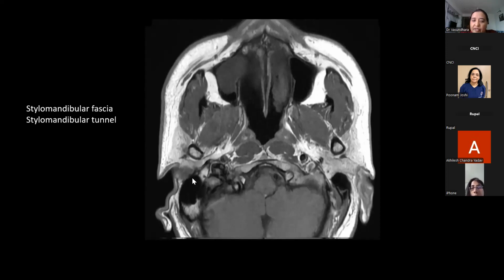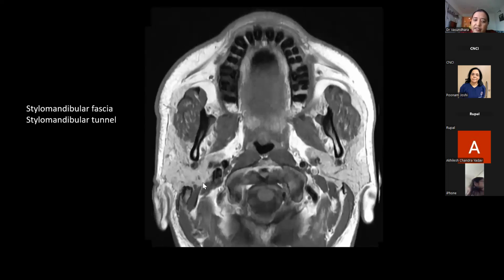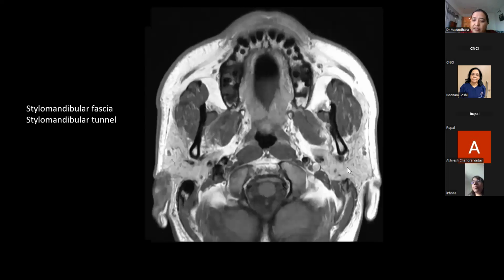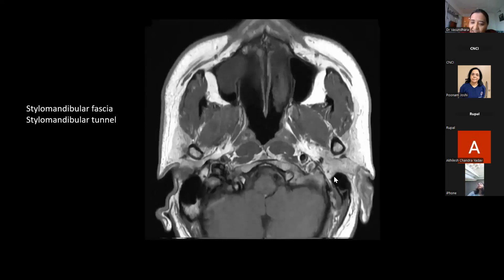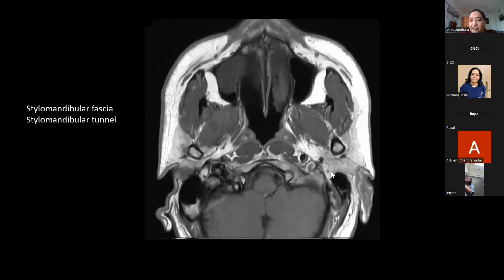Similarly, on the opposite side, the mastoid, the styloid, this is almost reaching the stylomastoid foramen, and this is the nerve. Trace it laterally and you will see this nerve in all the patients. Similarly on this side. So at least after this talk, I think every one of you will be able to trace this facial nerve on MR.